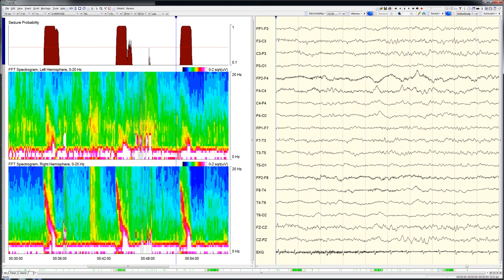Now let's page through the EEG to see just what happened. By clicking on a spot in the trends just before one of the major changes, I can select this time as a starting point and then page forward through the EEG. The vertical blue cursor line in the trends will synchronously advance as the EEG pages forward.